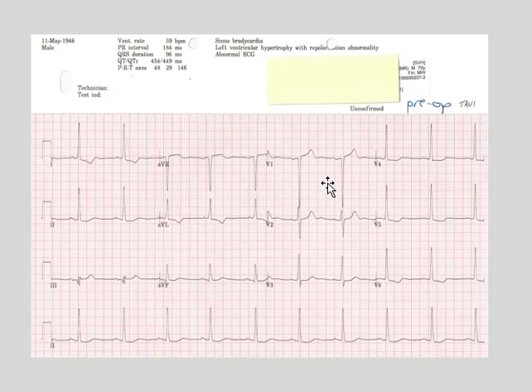And it's most likely associated not with a true Q wave and existing infarct, but some of the S wave in V1 and the R wave in V5 is definitely here more than 35.